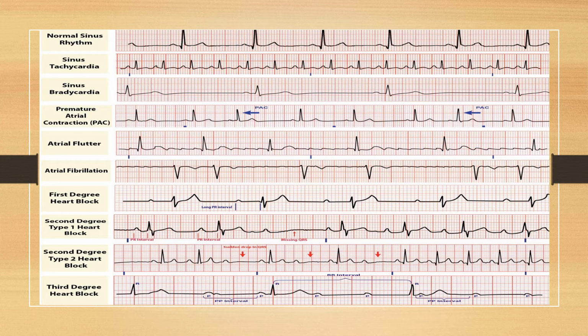Okay. Oh, it's mentioned atrial flutter. Sorry. I thought it was saying atrial fibrillation. This is atrial flutter. So there's those P waves, that's that electrical circuit going around the atrium. Okay, and some of them are being allowed through to the ventricle from the AV node and being conducted and becoming a QRS. Okay, so you can see those little P-like waves. Most of them don't have a QRS attached to them, but every once in a while the AV node lets one through and you get a QRS. So they don't have that typical sawtooth appearance, but this is atrial flutter.